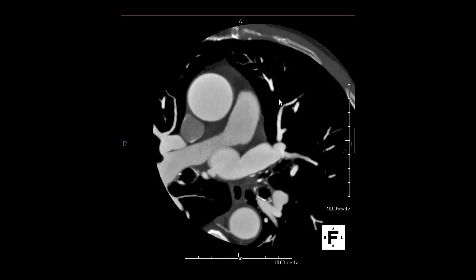This is case L3CT A68. The case history is that of a 79-year-old woman who has known moderate aortic stenosis established by prior echocardiography, who now has progressive shortness of breath and dyspnea on effort.